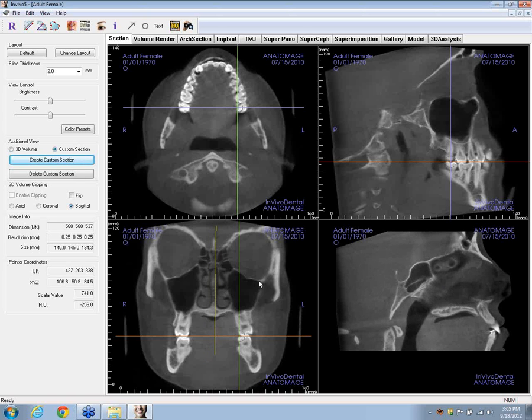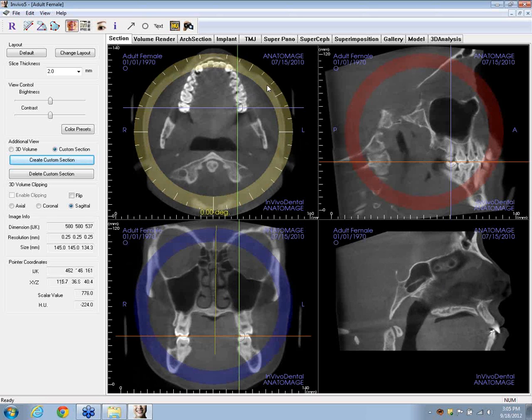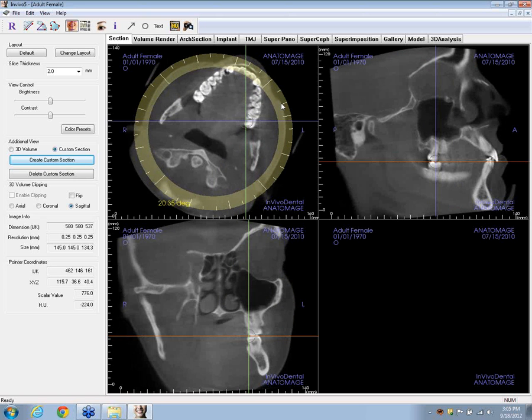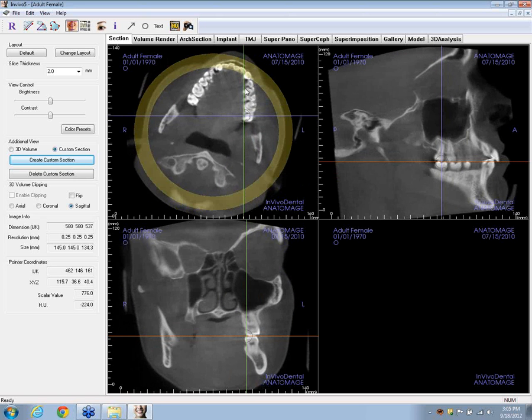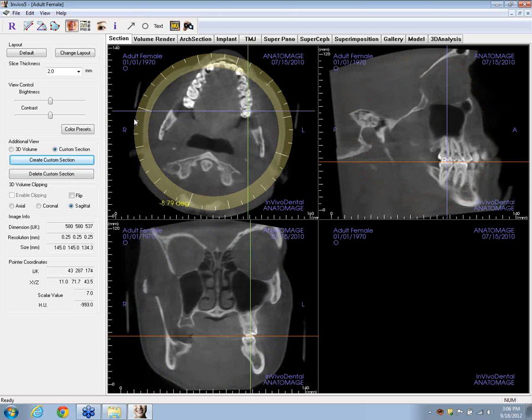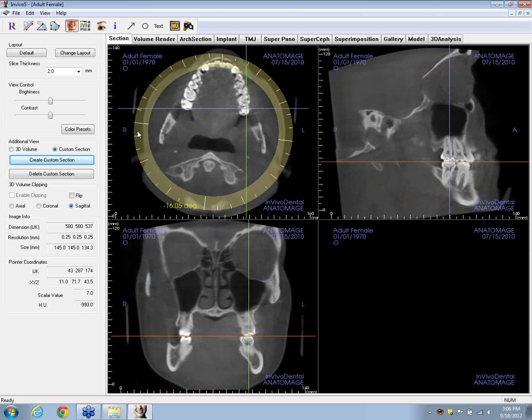All right, so we don't have to throw things off. We don't have to tilt this off in order to be able to look at the plane of this arch. I've got a plane constructed across here right now. We don't have to throw things off in order to get that established using this reorientation.